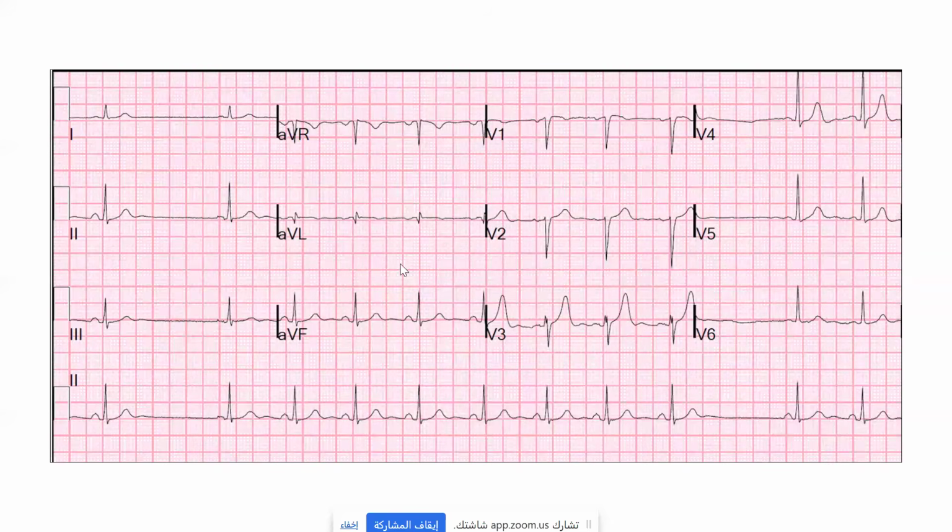Excellent. Thank you. Yalla. Anyone else can contribute here? What is this kind of ECG? We will slow the rate, instead of leaving you tachycardic, let's make it a bit bradycardic. Yalla.